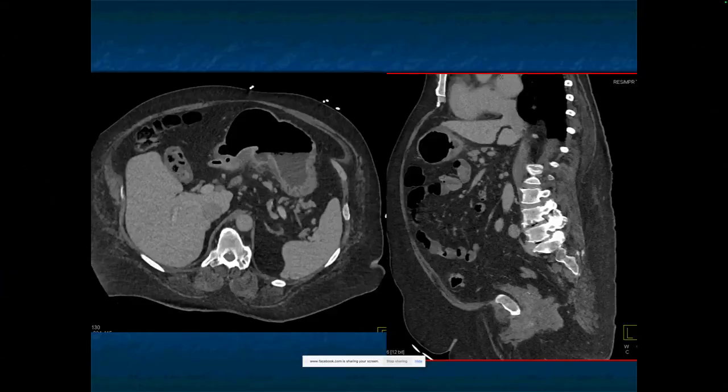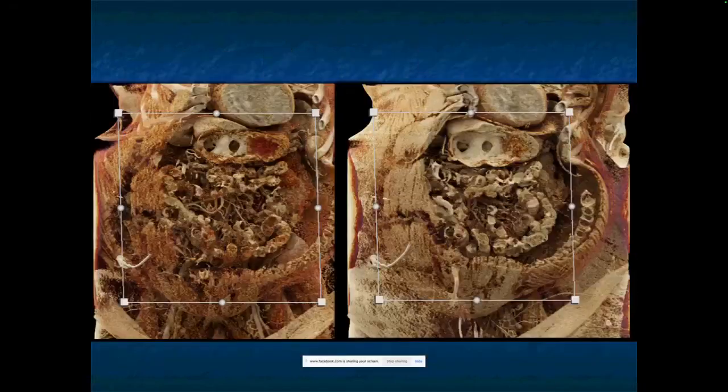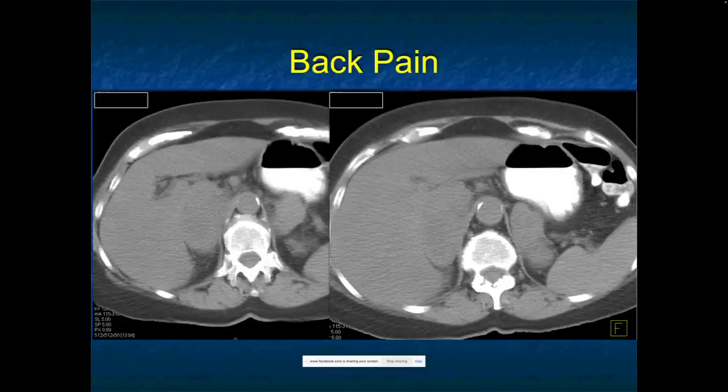On the image on the left, you also can see large... very aggressive looking benign processes and not so aggressive looking malignant. And if you want to know, this was a benign ulcer. Okay, I love those cinematics.